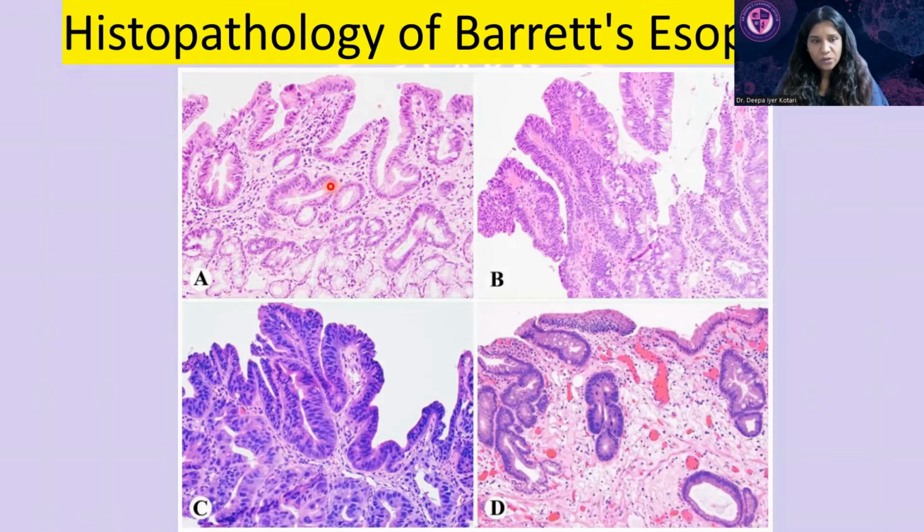There is no stratification of the nuclei here, even at this power. The nuclear membranes are showing a roughly uniform appearance. So you don't see much of an activity there. And there is no mild atypia also. It looks absolutely fine. But you can still call it negative for dysplasia even if there is very mild atypia in the basal regions, which is common in Barrett's.